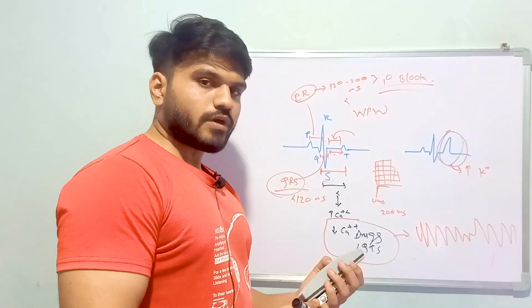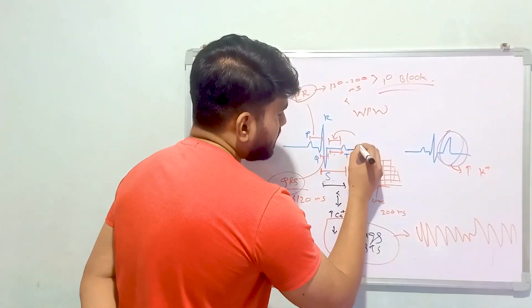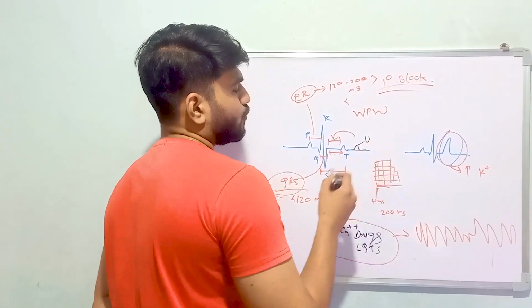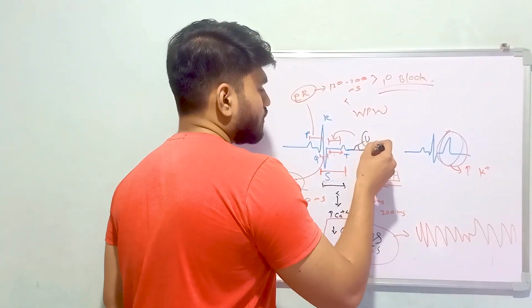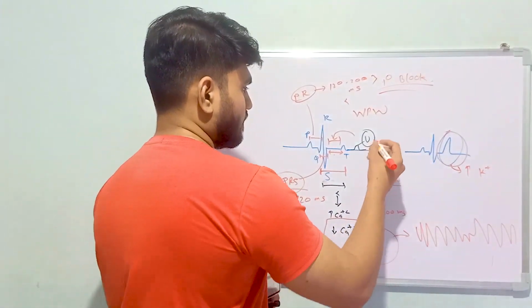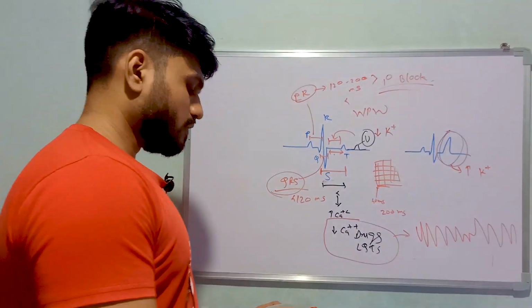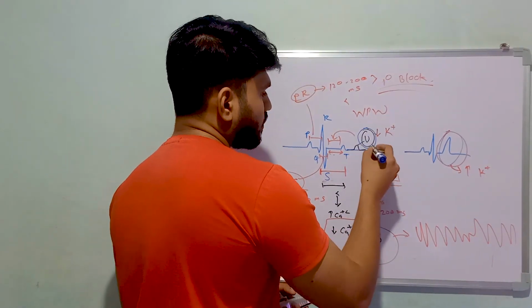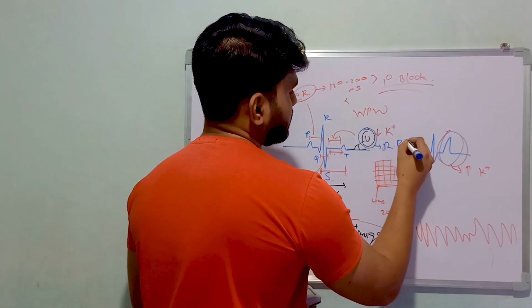So moving forward to another wave, which is the last wave that you cannot see in here, but sometimes you will see another wave looking like a T wave, which is our U wave. Like I have told you in the beginning of the video, you can sometimes see the U wave. You will see the U wave when you have low potassium level, when you have hypokalemia. Okay, and what will this represent? Sometimes it will represent the repolarization in Purkinje fibers.